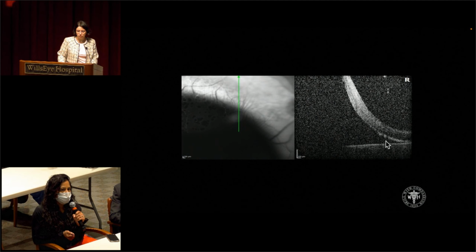If we're trying to tell temporal timeline here, one could argue that maybe there is a little bit of chronicity indicated by a little bit of shagginess to these photoreceptors, although I don't know if that's just shadowing artifact from these hyperreflective foci in the vitreous, but overall kind of a degraded image secondary to this large mass. And then on the IR, you can obviously see this large hypo-reflective area correlating to the mass.